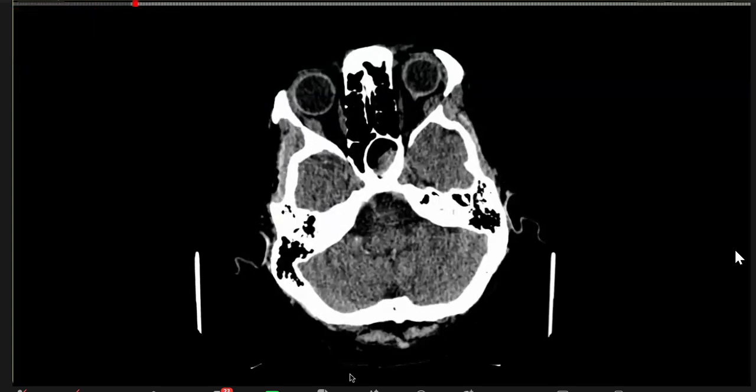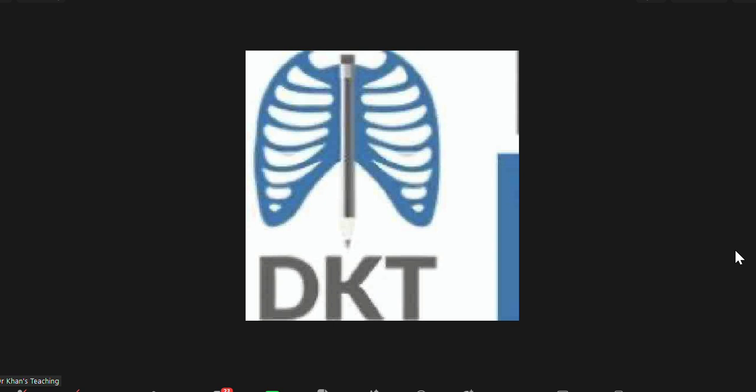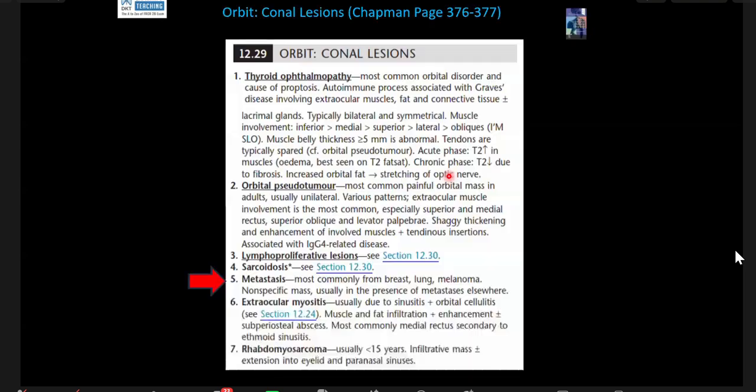So when the history has been provided, what else can it be? So the point is that this is the differential diagnosis.